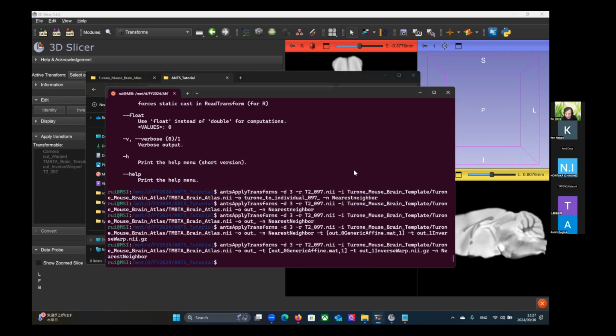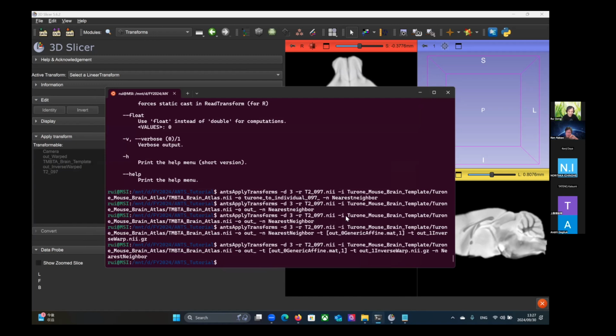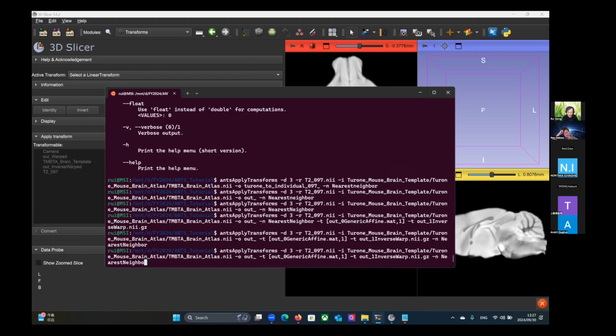Okay. Why? Let me see. I'm not sure why this is not working. I don't recall. Everything is correct. So sorry, let me just, so what we can specify is two parameters for t.